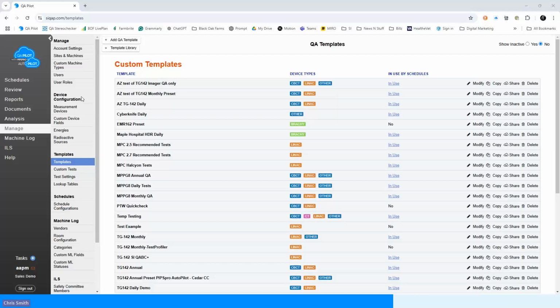And so those two products work really well together, not only if you're focusing on the precision of the image analysis, you really need to scroll through the image sets. That is really the power of PIPS Pro. And Autopilot includes some tests that PIPS Pro may not, right?